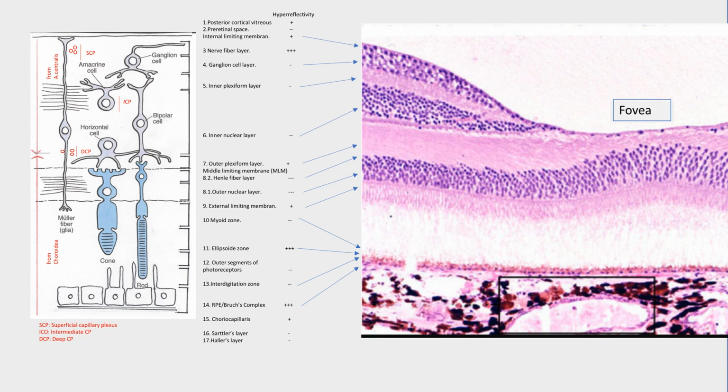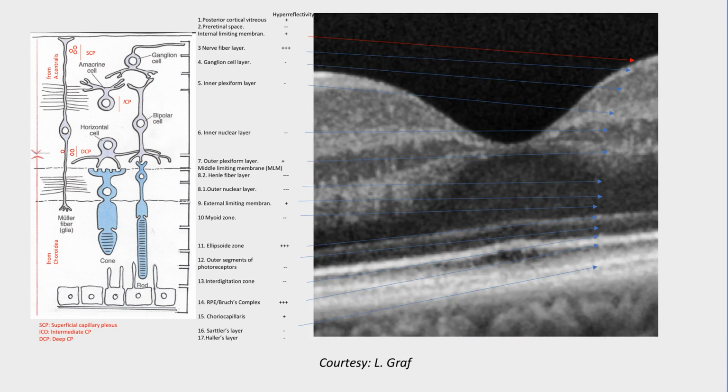The layers of the inner retina reappear more laterally, welcoming the nerve fibers of the cones. The layer of the fibers of Henle starts laterally, assuming a horizontal course. Here the arrows to the different layers.